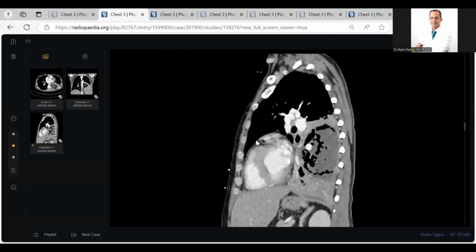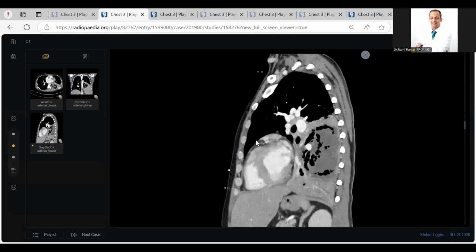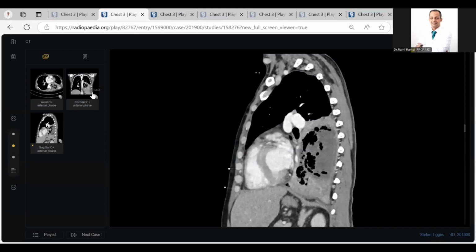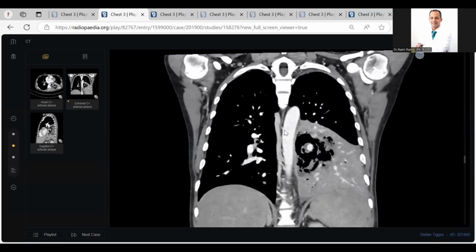In case of infection or severe infection in the lung, I should exclude pulmonary embolism, pulmonary aneurysm. What do you detect? Yes, now I can see. Yes, it is inside the lesion. Okay, what type? This is a mycotic aneurysm.